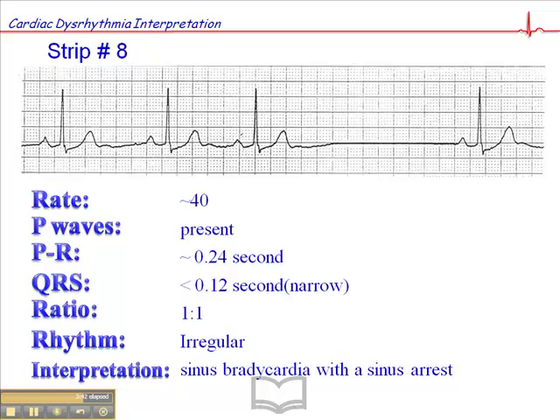And so how long are these pauses? How frequently do they occur? And what are the patient's signs and symptoms when they have these pauses? This is the kind of information we need to ascertain to determine what kind of treatment they're going to receive. And this is important information to report to either the triage nurse or the physician you're speaking to, or, if you're a physician speaking to another physician, this information is critical.